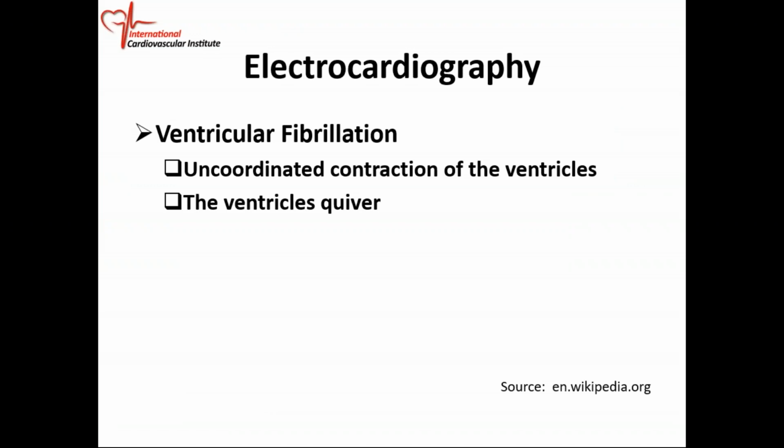Ventricular fibrillation. This is a terminal rhythm. What we mean by terminal rhythm is, if nothing is done, you're gonna be dead. Okay? This is how most people, or a lot of people, die: from ventricular fibrillation. It's a terminal rhythm. If nothing is done, you will die.